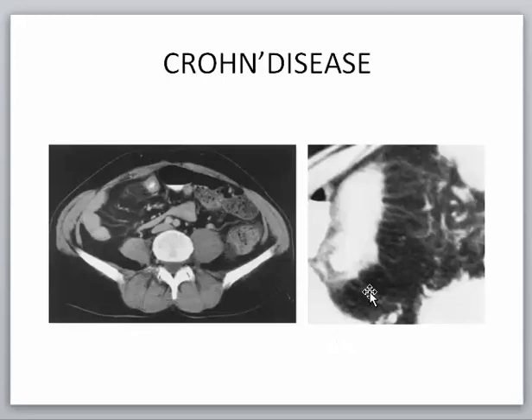It's nice to see this CT for Crohn's disease, in which we can have congested vessels and hyperemic periedematous tissue appearing as black around the vessels. This is vascular edema, and you expect this vascular edema due to the inflammatory process going on.